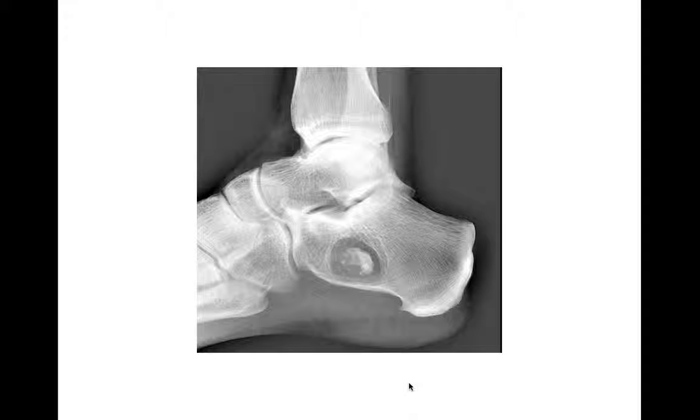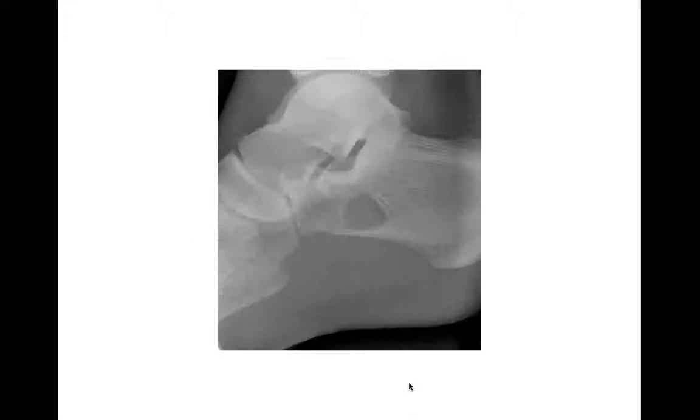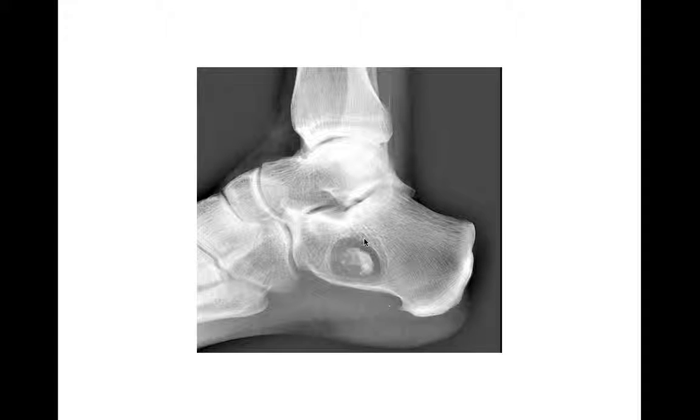Occasionally you can get faked out and it's not really a lesion at all. You may see something that looks like this, and it's going to be just kind of a trick of the eye from the trabeculation pattern, which creates a pseudo lesion there. That's easy to prove if you just get a different view, or if they went to CT or something, you'd see just how the trabecular pattern goes around there, creating this optical illusion of a lytic lesion when there's none really there. That's the third possibility, but again, it's a benign thing, so it doesn't really matter. In that case, it's not even anything. So really think of a unicameral bone cyst or an intraosseous lipoma. And remember, for intraosseous lipomas, they tend to have this central calcification.